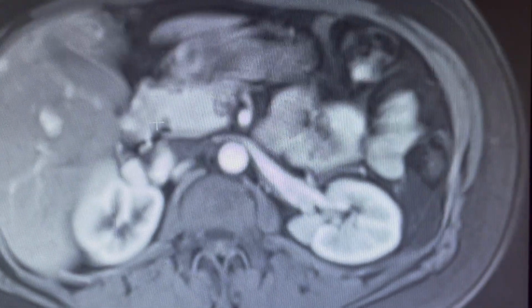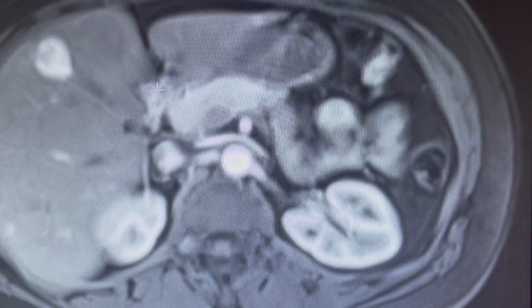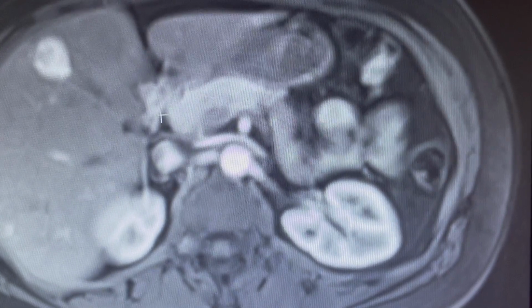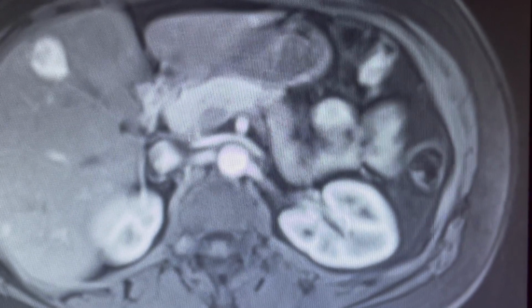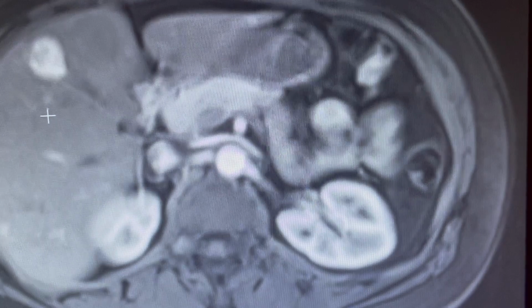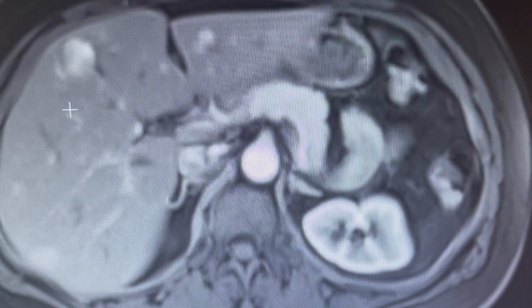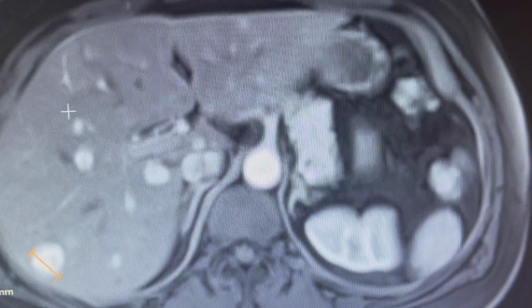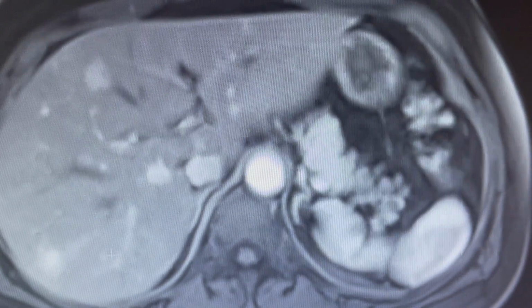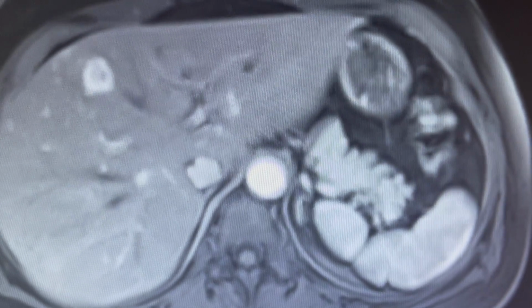Paging through, we see the proximal duodenum. This is duodenum right now. I would say that this is too intense enhancement. This is very similar to the aorta and very similar to the renal cortex. But notice that we see all this intense arterial enhancement now of many more lesions. And the ones that we're now seeing all measure less than a centimeter, in fact, less than 5 millimeters.